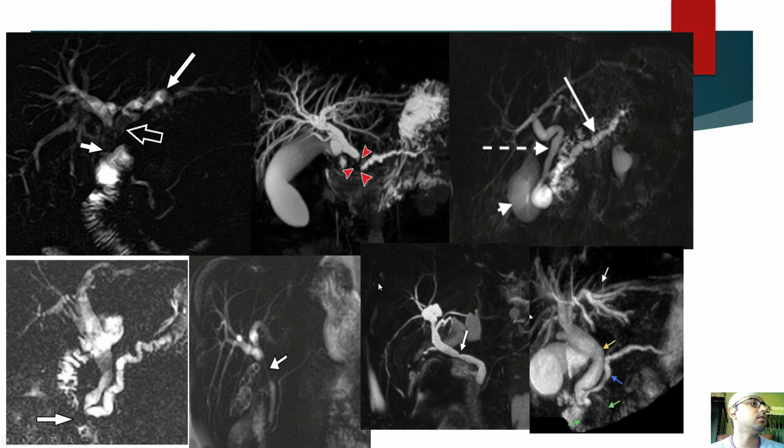Single signal void. You have to mention like this, because in MRCP film discussions, your teacher will try to know whether you found the stone, or you can explain about the signal void from the lesion, right? So this is the important thing you should mention in your exam.